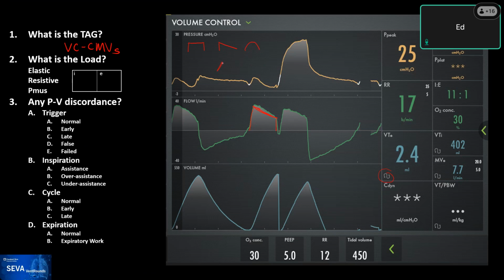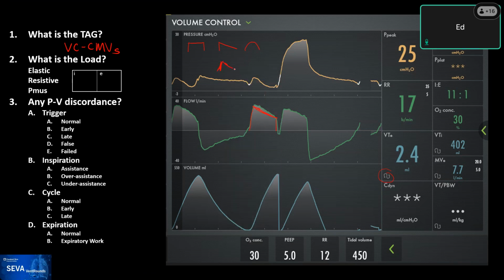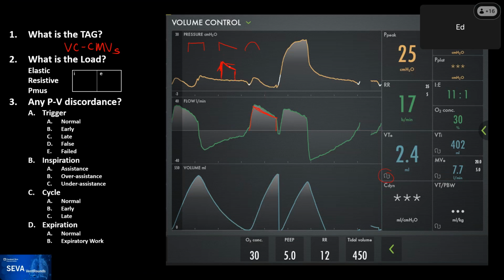And you can see that there's such inclination here. And the second thing that you can set is not only this one, but you can also set where the flow ends. So if you imagine this is the peak, you can set it to finish at 40% or at 80%, or all the way to 0, depending. You can move that value, and it's a setting that exists in your settings, but that will alter how the waveform would look and how then the flow is delivered.